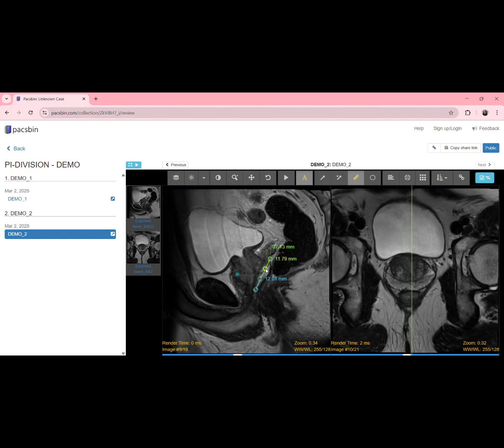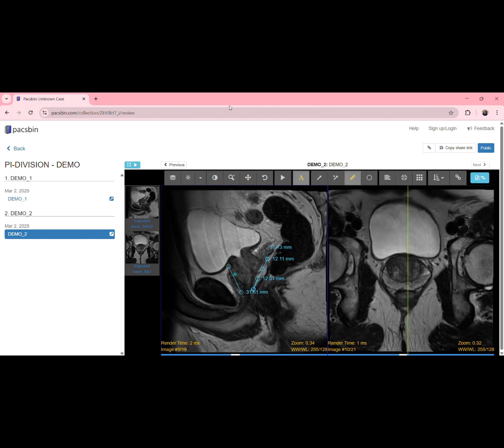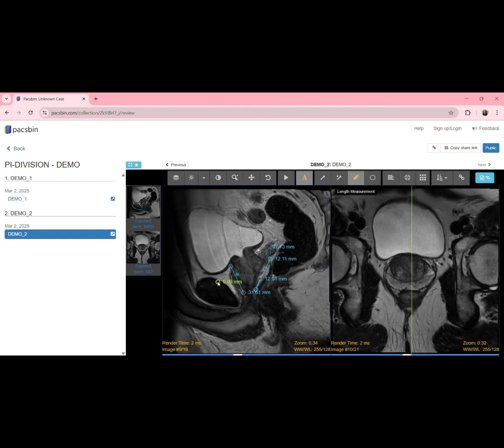Once the lines are drawn, you cannot erase them. You can move them along all the image and make them bigger or smaller. Also, they will be only in one cut. So if you scroll in the sagittal plane, you will see your dots, but you won't see your lines in all the cuts. You have to replace them to see your division in the central sagittal plane.